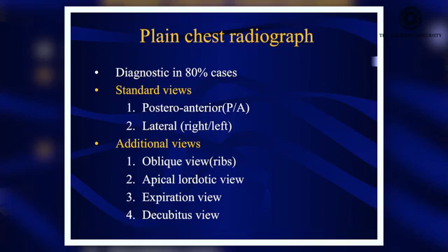Apical lordotic view, I'll show you an example. It is for the apex. Expiratory view: previously, for pneumothorax, they used to do an expiratory view, but now it's obsolete. We no longer require it, and pneumothorax should be able to be diagnosed on a plain X-ray.